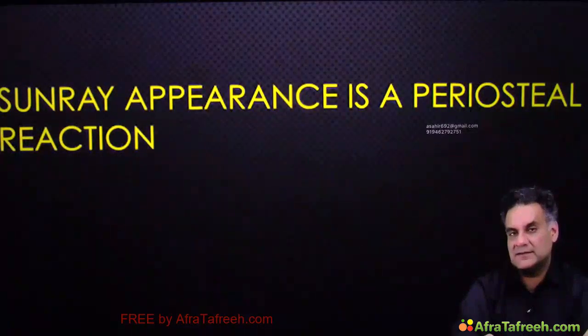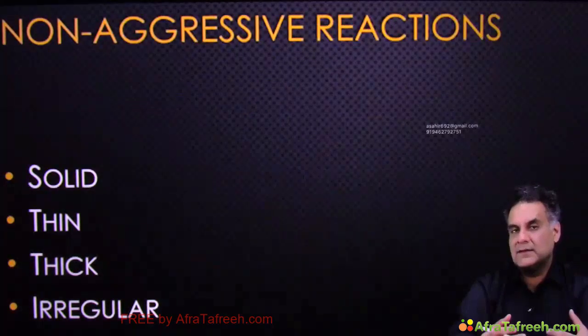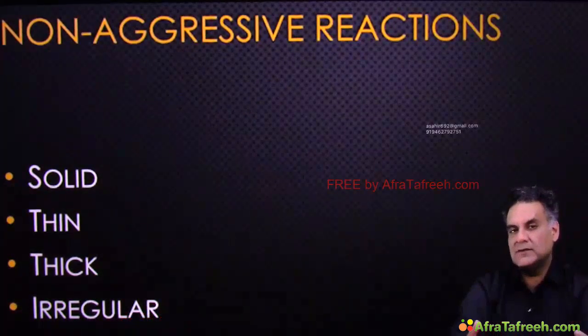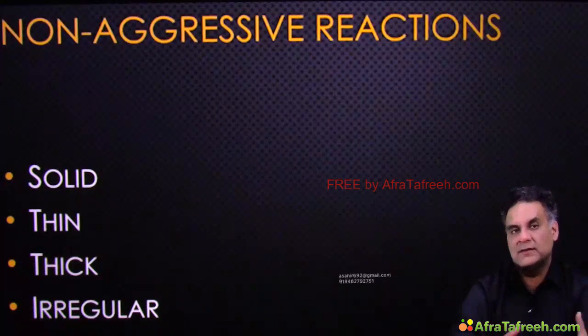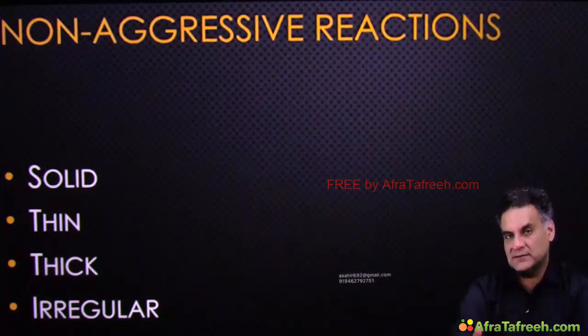Sun ray appearance is a periosteal reaction. It's a controversial point, do remember. These wide zones are also called aggressive lesions, and narrow zones are non-aggressive lesions: solid, thin, thick or irregular reactions.